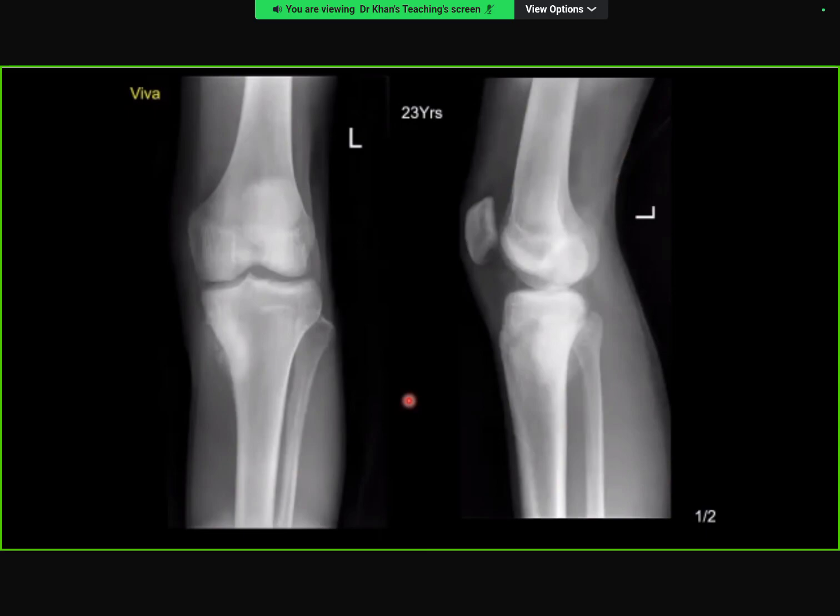So the lesion is ill-defined with a wide zone of transition. It's eccentrically located in the medial cortex of the left proximal tibial metaphysis. There is osseous matrix and an aggressive periosteal reaction. There's possibly some irregularity of the cortex, and there is some cortical irregularity indicating cortical destruction, and the lesion appears aggressive, and the differential is of osteosarcoma or less likely Ewing sarcoma.